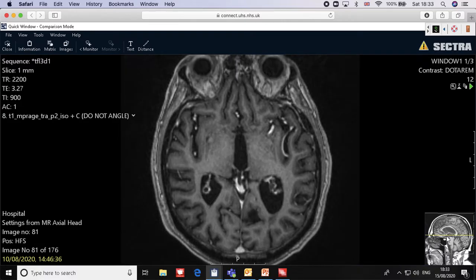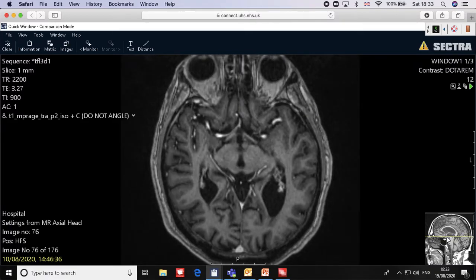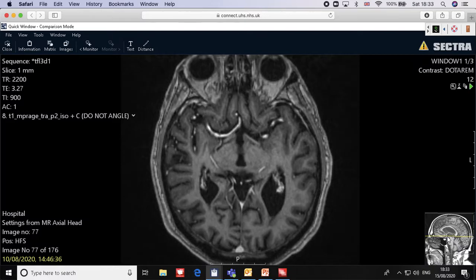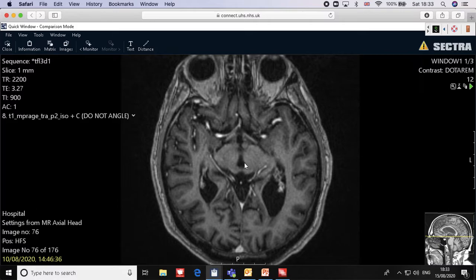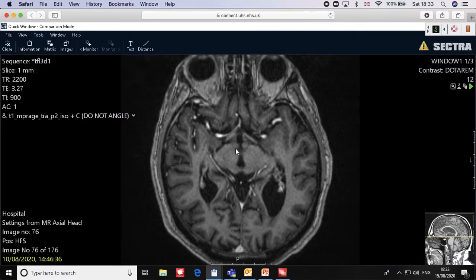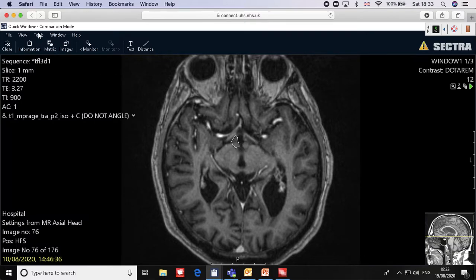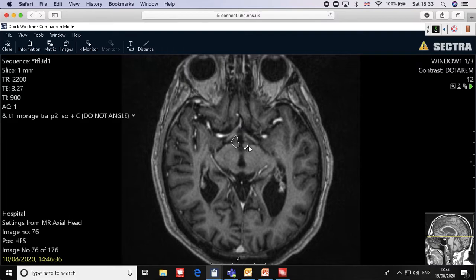Okay. Good. So draw the first slice in between the optic tract, as we did in this way. Oh, it disappeared. So draw it again here between the slice. Let's try to do our best. So the mammillary body is in between the optic tract. This is part of the hypothalamus. Okay. Do another one.